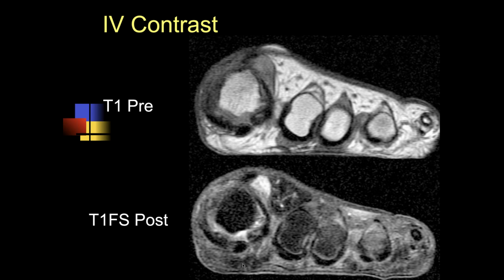All right. So we're looking at, I think this is the first metatarsal, beginning of the sesamoid bones. We see a focal increased fluid along the dorsal aspect of the tarsal, kind of expanding out there. Are we just looking at a bursitis or a joint effusion?